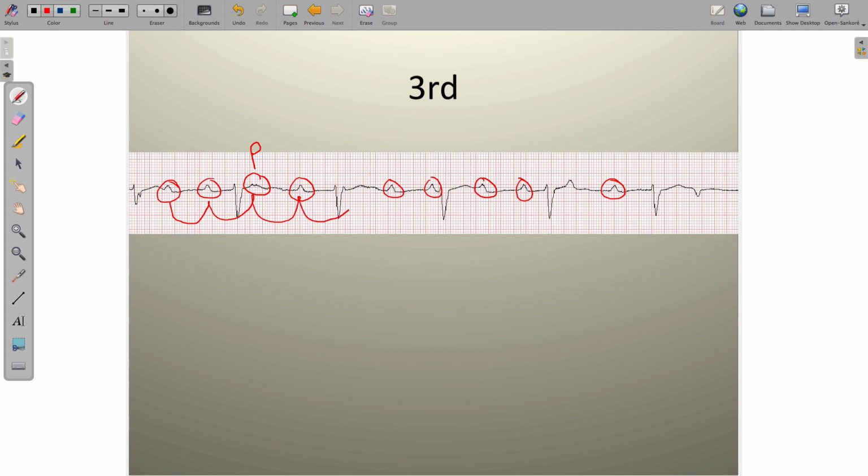Same concept here. Go here, there is a P wave that's buried, and you'll start to see that actually the T waves look different. And the reason they look different is because they've either been masked or mimicked by the P wave. So let's take a look here at what I mean by that.